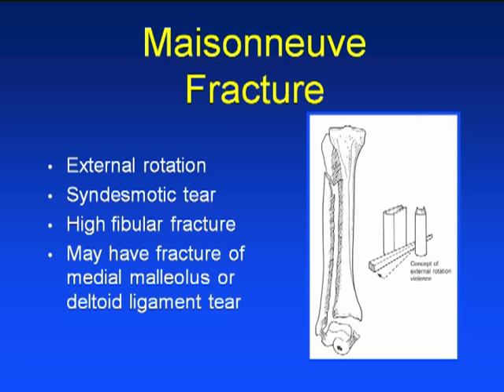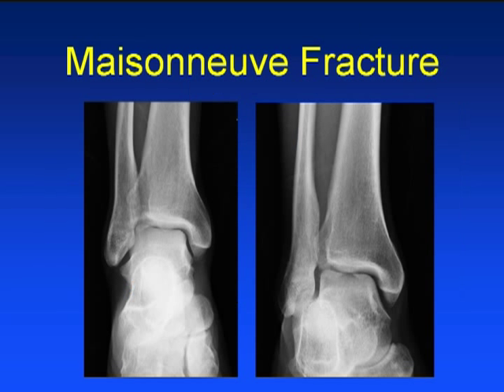They're actually kind of common. Whenever you see widening or irregularity at the ankle and you can't find all the fractures to explain everything, get a proximal fibular fracture or fibular image. This is a pronation, external rotation, type 4 that's gone really, really high. It's a fracture gone wild if you watch those videos. So it's way up high and it goes to the proximal fibula. The angle is that when you externally rotate and put a torque on the fibula, you can just tear along the syndesmosis.